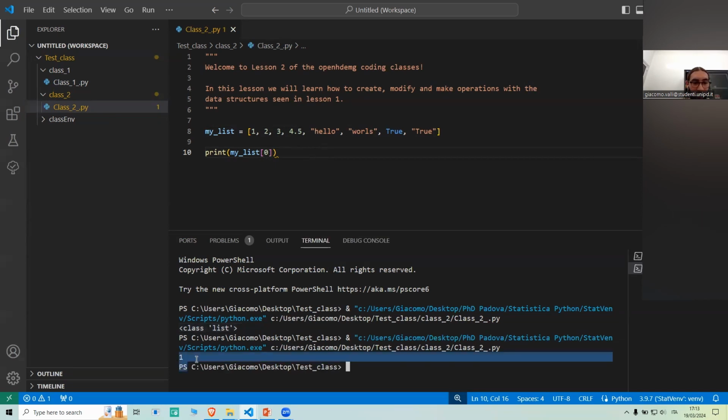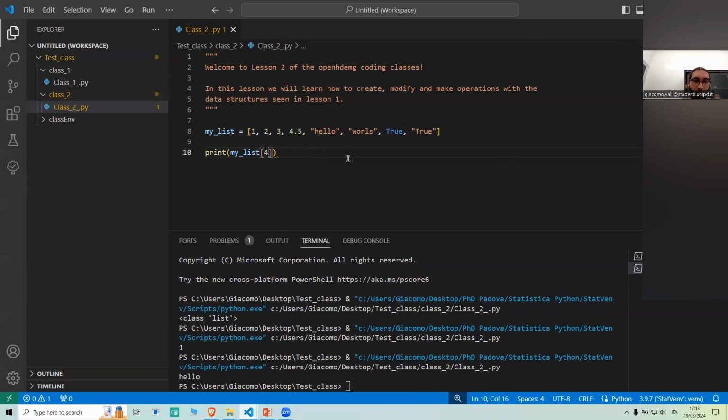And as you can see here, we have 1, okay, which is the first value. If you put 4 here, we see the word hello. So indexing is very simple if we only need one value. It's simply done by position in lists because we don't have any element describing what there is in any position, compared to dictionaries, as we explained last time.